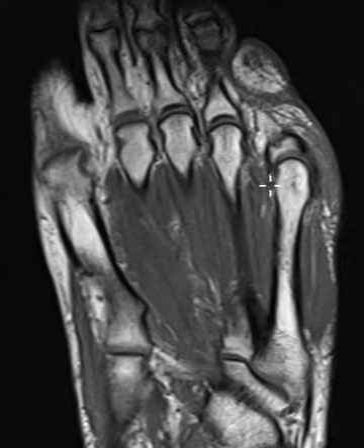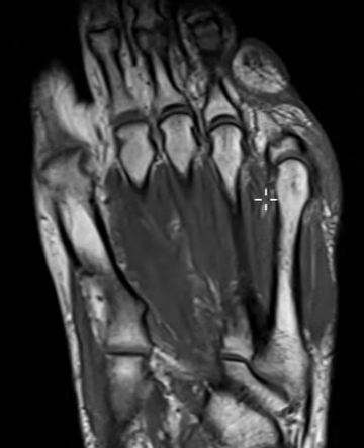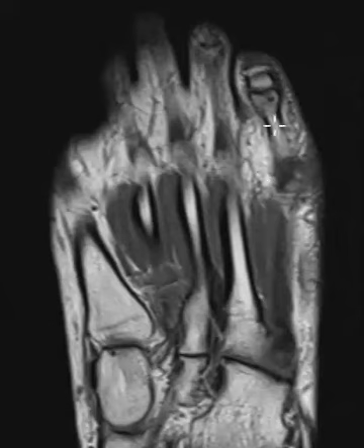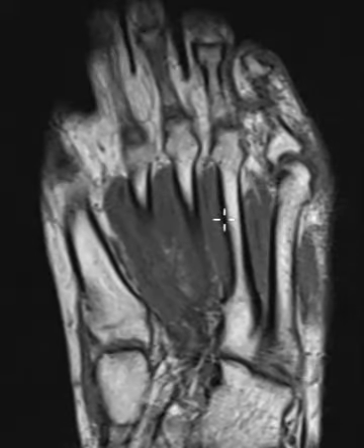This is a 48-year-old male with complaints of fifth toe pain. They saw the podiatrist. They did an x-ray. They thought they probably had a fracture of their fifth toe or a stress fracture. They did not see a fracture, so they thought, well, maybe it's just a stress fracture that is not showing up. So this is an MRI to look at the bones.